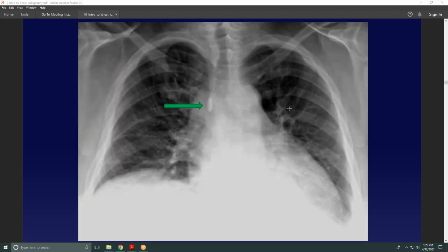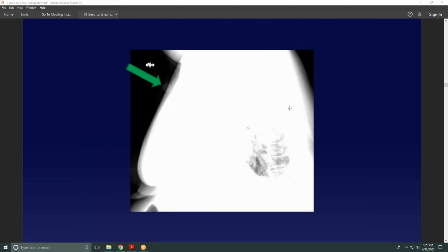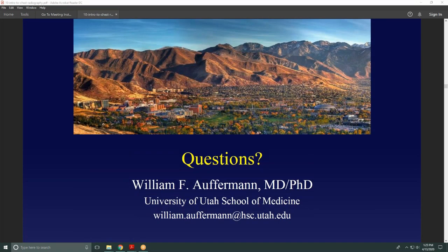So this is an example of where a lateral radiograph can be very helpful, okay? And so that's your whirlwind tour of radiographic anatomy and whatnot. Do we have any questions? Please chime in. I want to answer questions as we go along. I want people to get something from this. I have a question about the silhouette sign, and then also with the subsequent discussion on superimposed images.